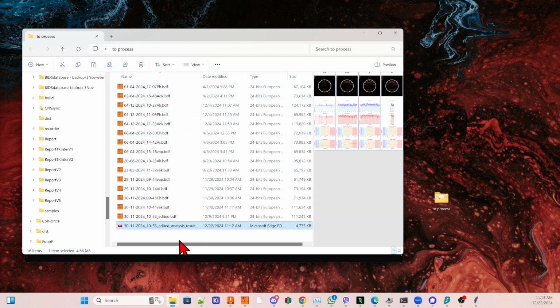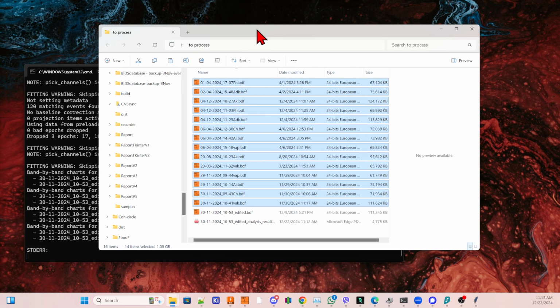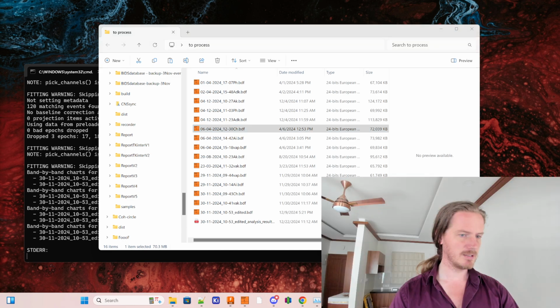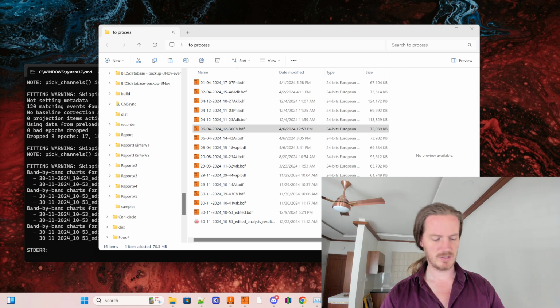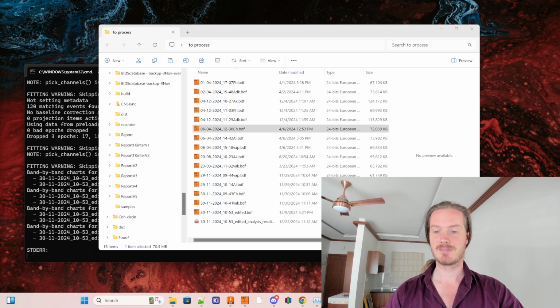But basically, we have 14 unedited, unannotated files over here, and it's 7 subjects, and every subject has 2 recordings, 1 before learning TM and 1 after. And half of these are controlled, so they don't learn TM at all. I have in my little notebook over here, I've written at what time they do which activity, so that is what we're going to be using.